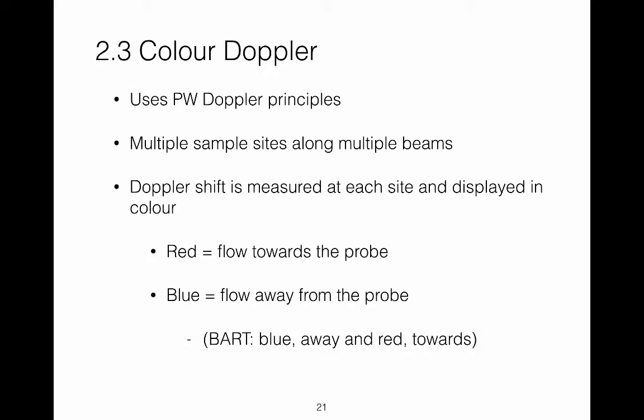Red color shows flow toward the probe. Blue color shows flow away from the probe. An easy acronym to remember is BART. BART. Blue away and red towards.